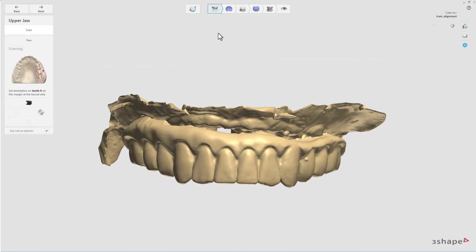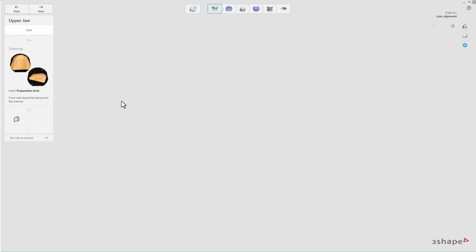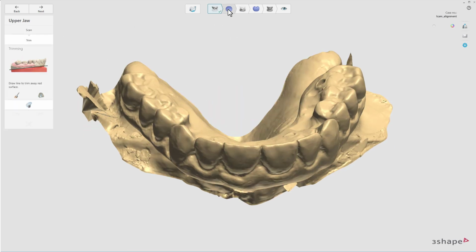And we're just, oh, their scans are actually backwards. The assistant said it, so we're going to get the lower. It's all coming back to me, as she scanned the upper as the lower as the upper. So mark it. Don't need to trim. We need all of this.